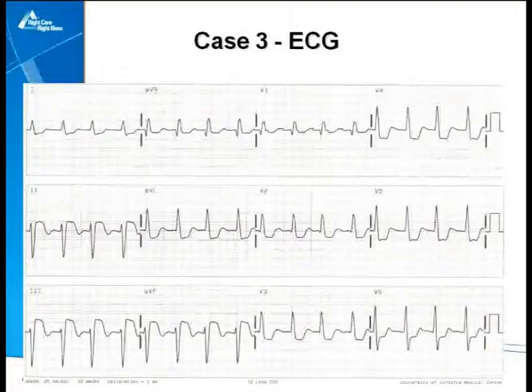And then the question is, can we identify normal P waves? Is this 1-to-1 or is this 2-to-1? And you have to look very closely. If you look up in V1, you can see that there are 2 notches, okay? And that this is actually atrial activity with 2-to-1 conduction. The atrial rate's about 190, so it fits in the range of an atrial tachycardia.